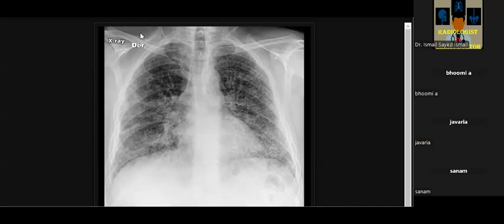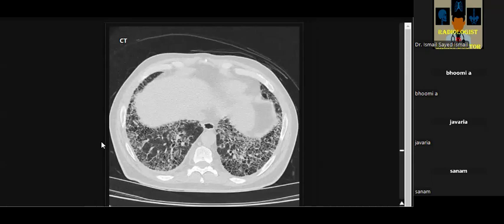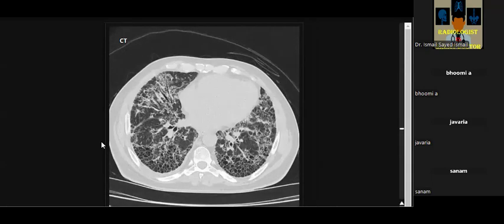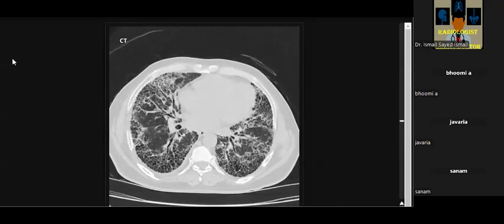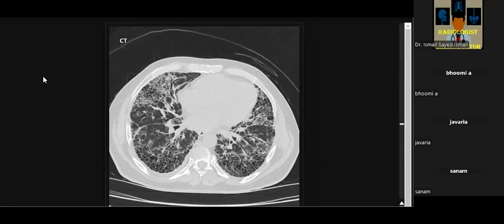Okay, so CT scan, same patient. I'm provided with the CT scan of lung window axial images. I can see multiple reticular opacities in subpleural distribution without areas of subpleural sparing in both lung bases, which is associated with honeycombing and traction bronchiectasis.